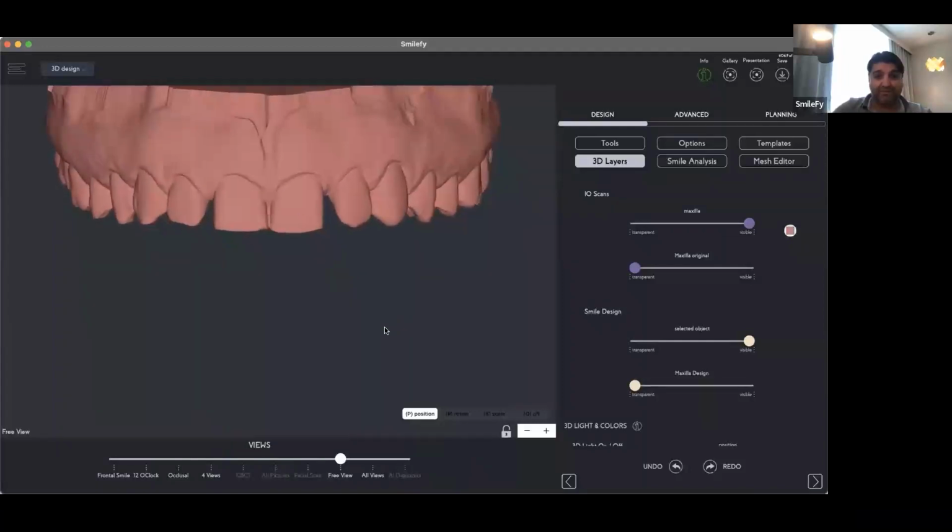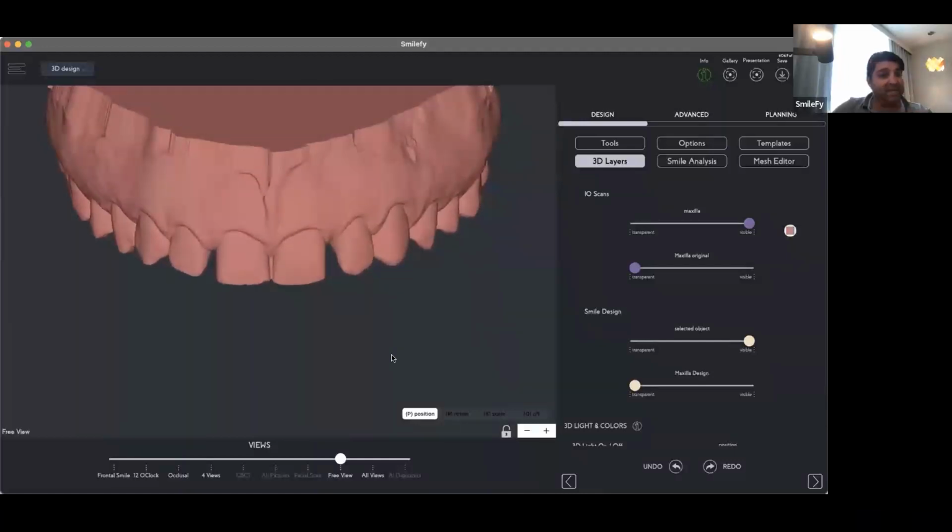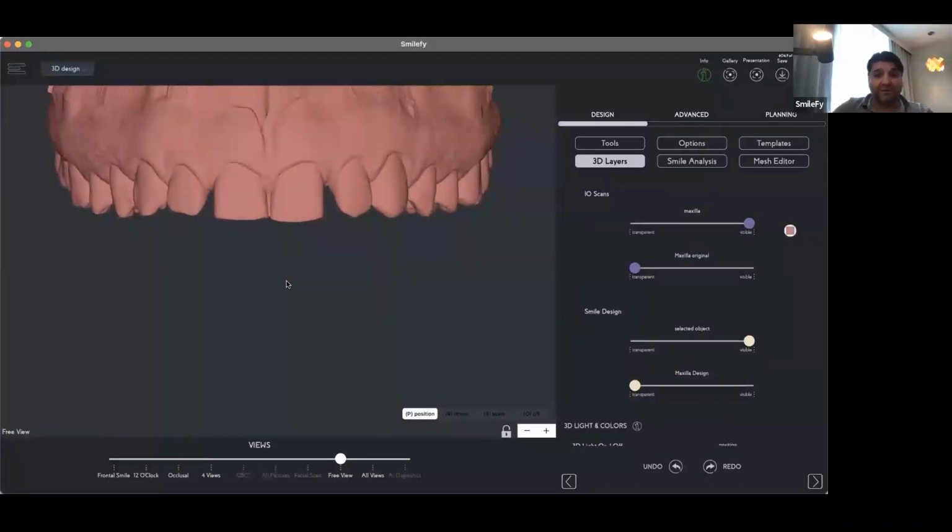It's a reverse smile. That's why the position of the picture is important, because if the patient looks down and it's not perfectly frontal, we analyze the picture and say, oh, we can work a little bit on the interproximal spaces, we can work on the new smile curve, but we don't see that actually the smile is inverted.